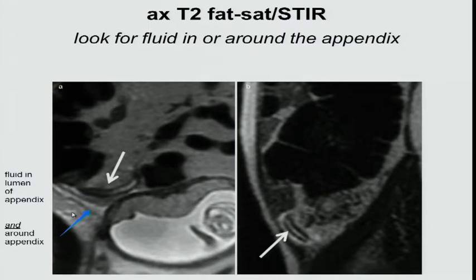So that's another thing to practice looking at. Does it look like there's something here that I could actually get out with my catheter, or if they went in to drain this? Because if it's phlegmon, it will usually respond to antibiotics. It's usually well vascularized enough. If it's walled itself off, it may not. So that's another way that you can help your surgical colleagues decide what they need to do to help the patient get better.